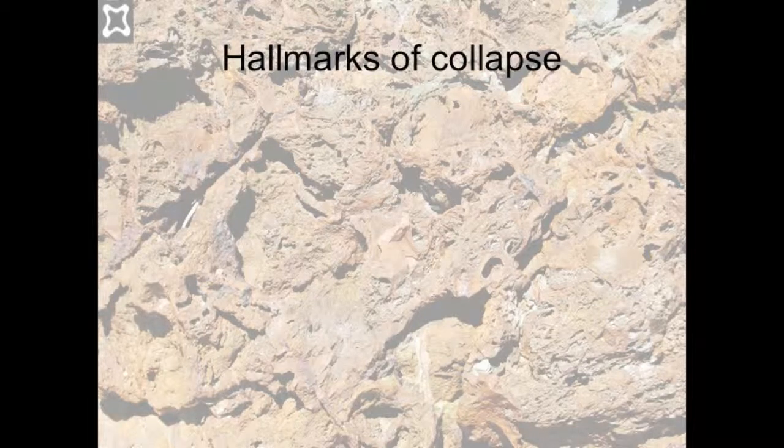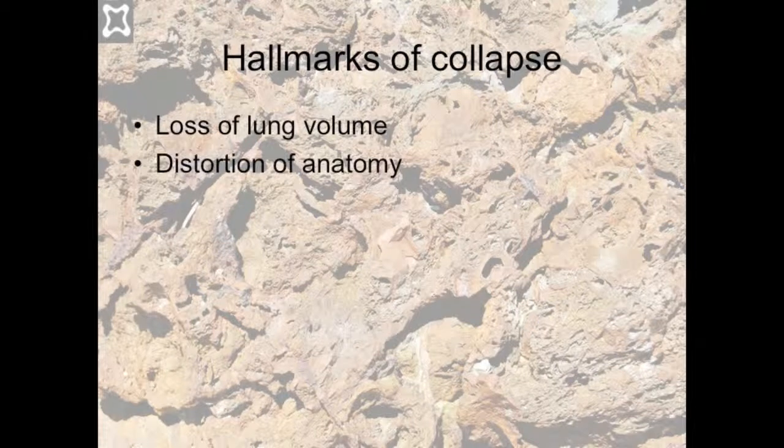The hallmarks of collapse are loss of lung volume with accompanying distortion of the normal position of some landmarks, along with classic patterns of lung markings depending on the lobe involved. Some types of collapse are more easily seen on a lateral chest X-ray. Unfortunately, this is often impractical in critical care, and heightened suspicion is required to make the diagnosis on an AP film alone.